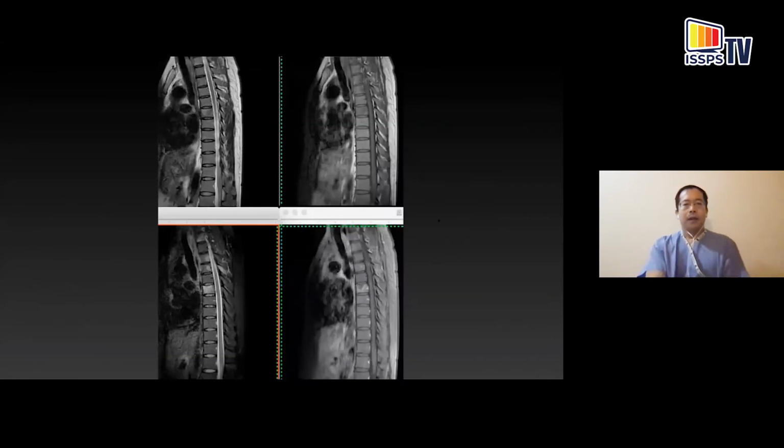Okay. Then from there, we move on to our MRI anatomy. I just want to quickly remind everyone, those who were here 2 weeks ago will remember this. How do you differentiate the different sequences on a thoracic spine MRI? The same for lumbar spine. Firstly, go for the fluid signal. So the CSF signal is going to be your guide. T2 weighted images have a hyperintense signal for the CSF space. And this reduces to almost a hypointense signal on T1 weighted images.